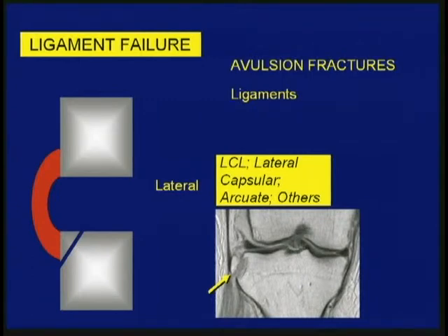What causes this is debated. I know everybody's been taught it's the lateral capsular ligament, but that's pretty flimsy. And if you look at your images, as in this one, you will always, or almost always, see a portion of the iliotibial tract attaching to the bone fragment. So I think that is one possible etiologic factor. That tract does attach to Gerdy's tubercle, but that's not the only site of attachment. It extends along the tibial rim. In any case, it's an important finding.